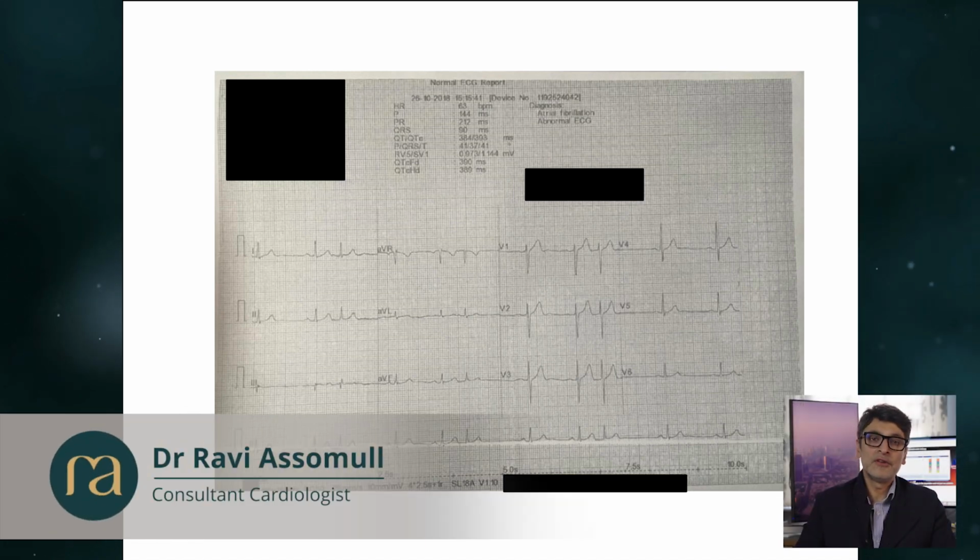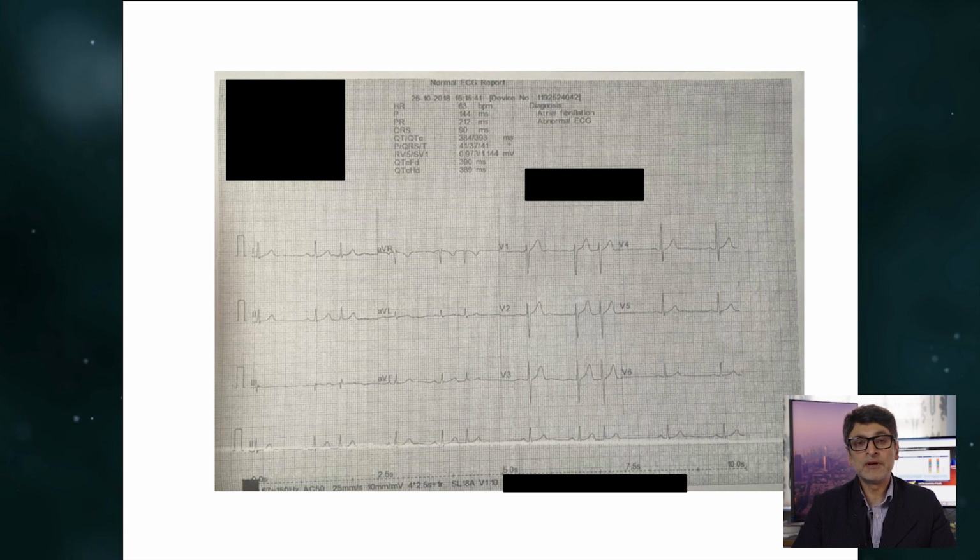So in this section, I'm going to talk to you about the real dangers of looking at the automated report on the top of an ECG. It's very tempting. I do it, but I tend to do it right at the end when I've actually made my own interpretation. It's often a fail-safe, and my interpretation overrides anything that is on the top of the ECG.